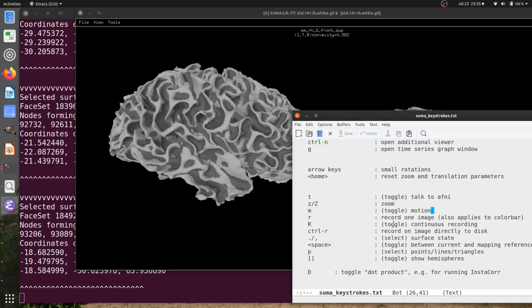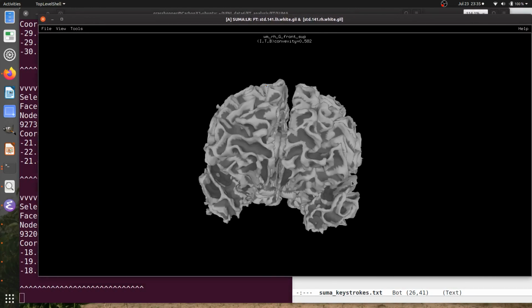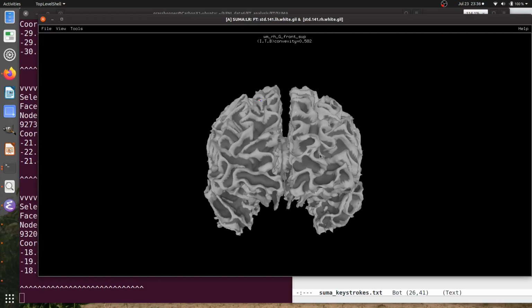Okay. And we've talked about some of these. All right, let's talk about the motion. One thing that you can do, let's see, Control-Shift up there. Okay, so I hit Control-Shift up to just get that coronal view.